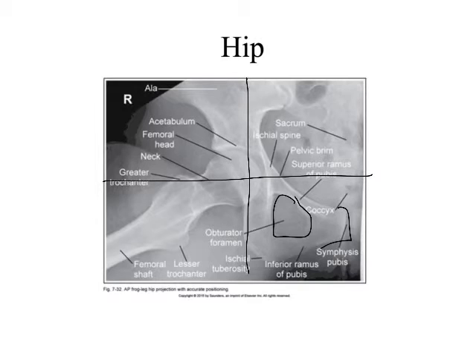So we have positioning concerns. What can we talk about technique-wise? What did we look at for technique on the last one? How did we make determinations on technique on the last one? The joint space, good. And then also we see some soft tissue. We can see some musculature here.